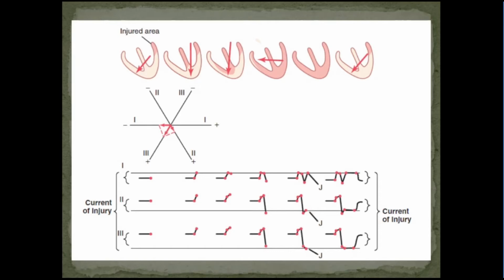Step 1. Look out for the J point. All this disturbance created in the ECG of myocardial infarction is due to the injured area. As you can see, this injured area stays depolarized continuously throughout the cardiac cycle. But this depolarization can be masked when the ventricle is completely depolarized. At this point, at the end of the QRS complex, the ventricle is completely depolarized and masking the injured area, and the ECG returns to the baseline. That is why it is very important to determine the J point.